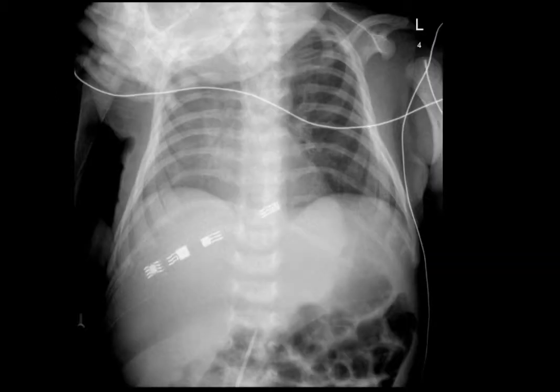Okay, this is the continuation of the discussion on respiratory distress, and in this part I'm going to spend most of the time talking about barotrauma or extra-alveolar air or air block syndrome, whatever term you choose to apply. But the first couple of cases I'm just going to show you examples of atelectasis.